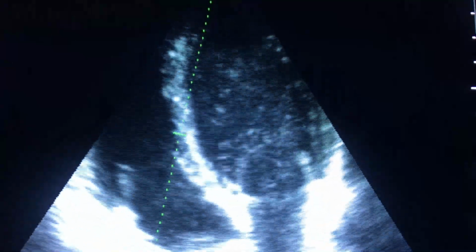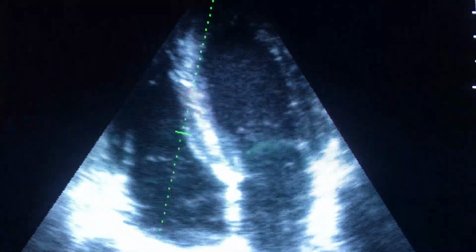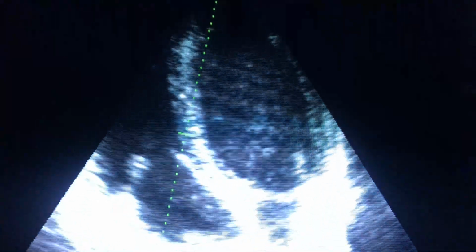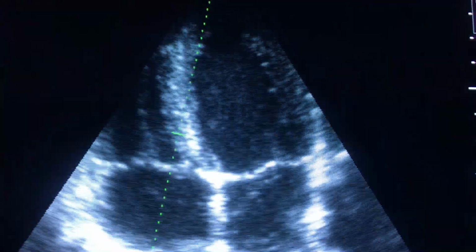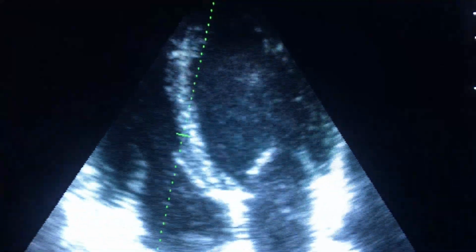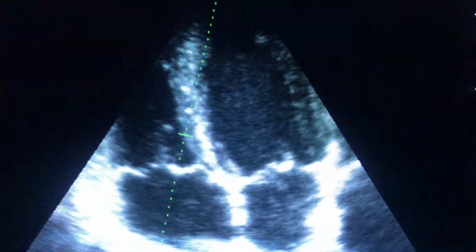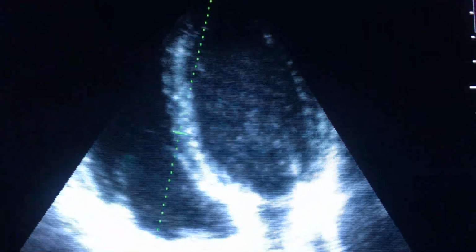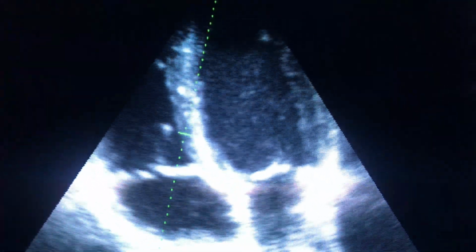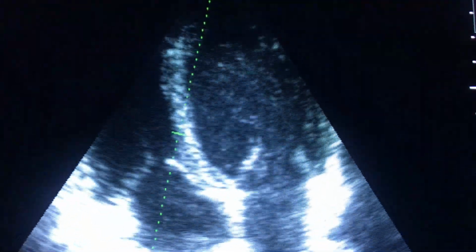But there is a non-smoke spontaneous echo contrast as well, which looks like a snowstorm and is usually related to Valsalva maneuver. It is due to transient stasis in the pulmonary circulation. Non-smoke spontaneous echo contrast can be seen in the inferior vena cava too.